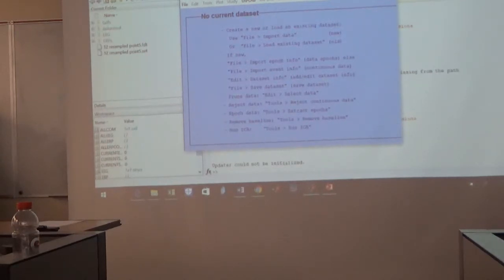These are the instructions. So come in here, and you want to delete the ERPLab 6. Then go to your ERPLab 5, and you should have had these files up here. You want to take that and paste it into the plugins folder. You can drag it in there and put it back in there now.